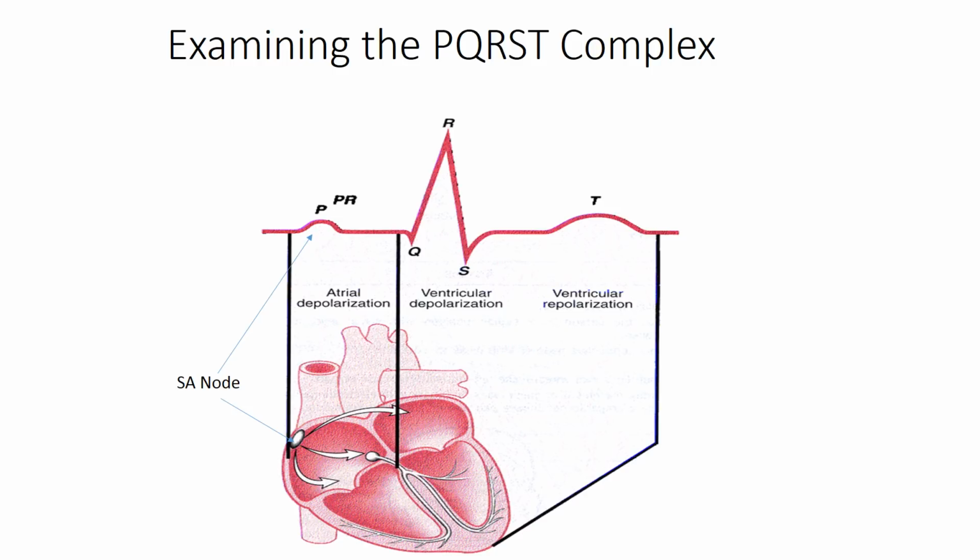So some takeaways here. Remember, if you look at an EKG strip and you see problems with the P wave, you've got an atrial problem. If you can't identify what it is exactly, that's not your first step, right? You're looking to see if there's something wrong with my P wave, the problem's in the atria. If I look at an EKG strip and I see problems with the QRS complex, maybe I don't know exactly what the problem is, but I know there's something wrong with my QRS complex. Now I need to focus on my ventricles. I have a ventricular problem.